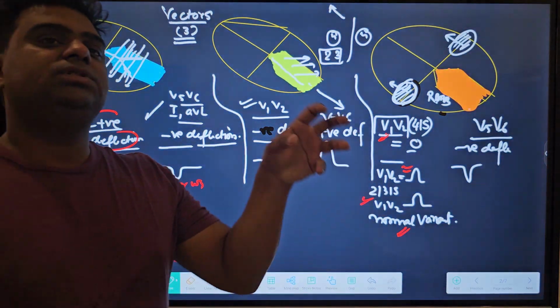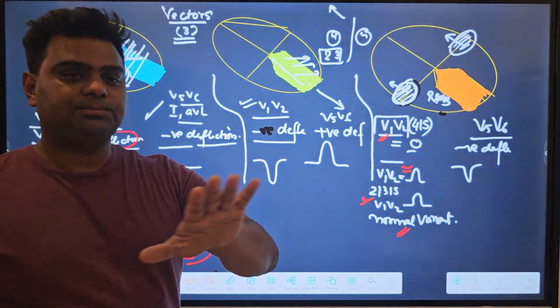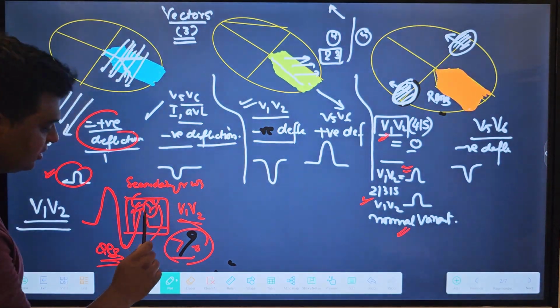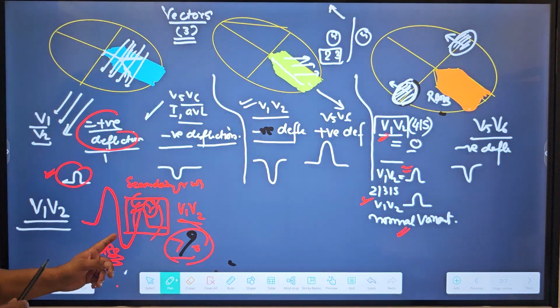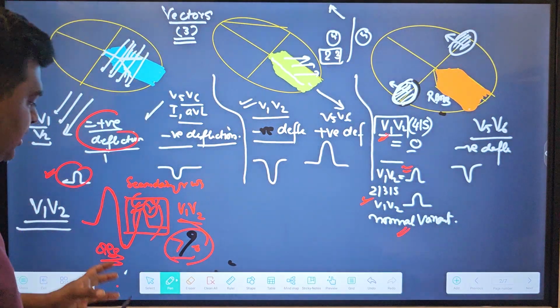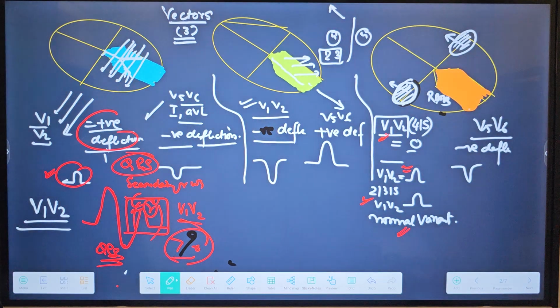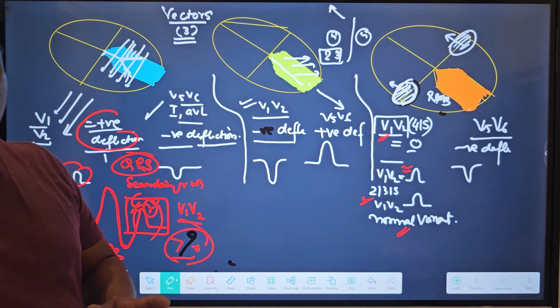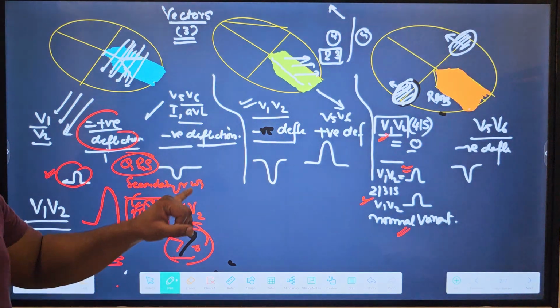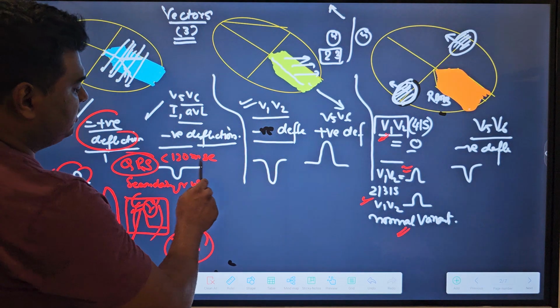There are a lot of papers on this, and if we again keep the V1 and V2 leads in the fourth intercostal space, this R wave will be lost. So how can you differentiate whether it is because of misplacement or it is really a right bundle branch block? It is by the measurement of QRS duration. If V1 and V2 are misplaced at the second or third intercostal space and measure basal depolarization, they can have a secondary R wave, but the QRS duration will be normal, that is less than 120 milliseconds or less than 3 small boxes.